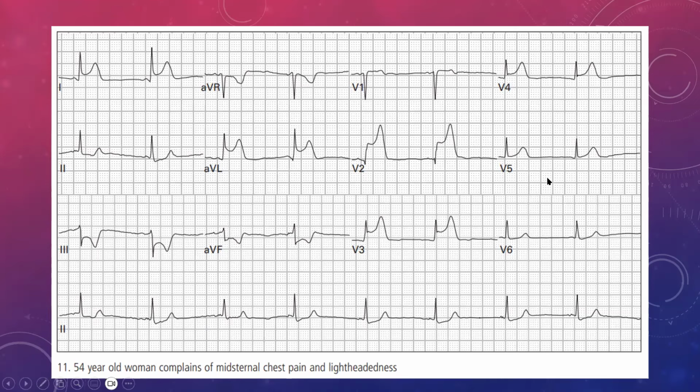Somebody's trying to talk or I can't hear you. Thanks. Let's see. Very good. Okay, severe. We've got one answer of moderate and another answer of severe. That's excellent. Whether you put it as moderate or severe, you're actually not very far off.